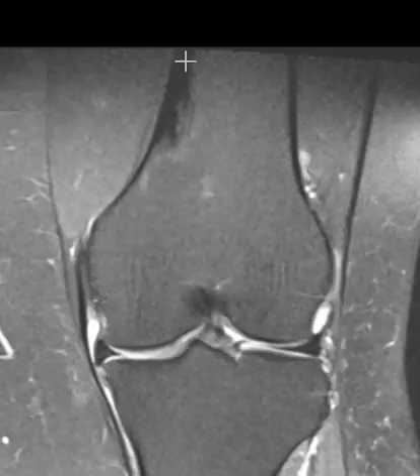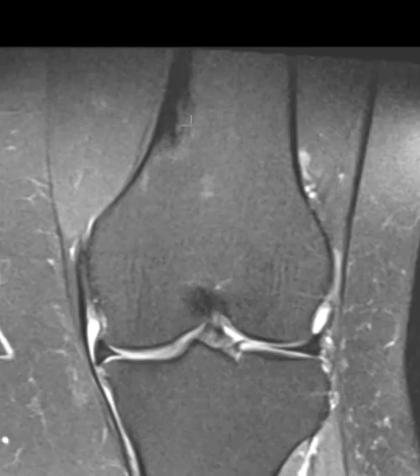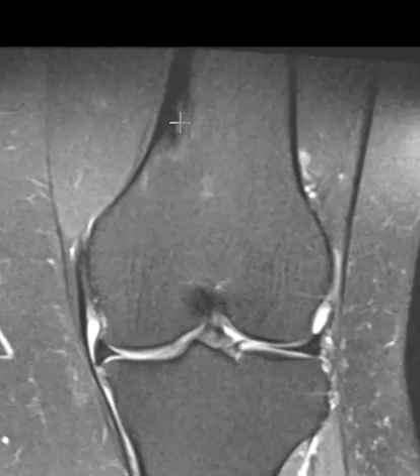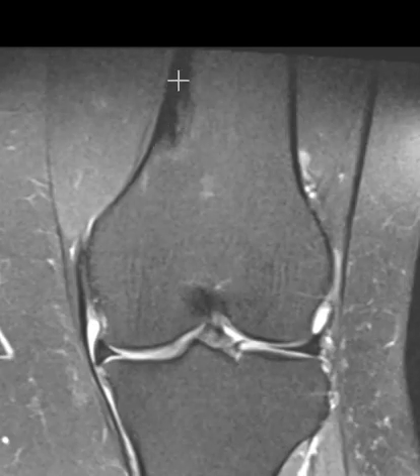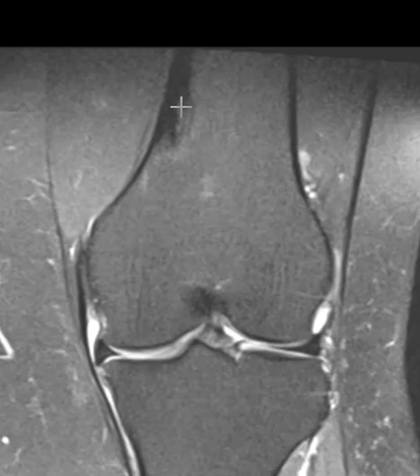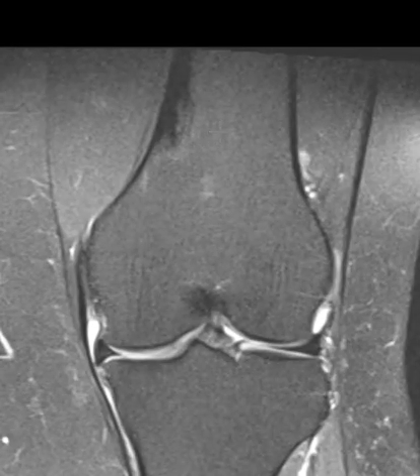A lot of people have these when they're young, in the pediatric age or adolescence, and then over time they involute and become sclerotic and dark like this, and sometimes they go away completely, but sometimes you're left with a residual patchy area of darkness. So this is just an incidental benign residual sclerosis related to an old non-ossifying fibroma, just incidentally here.